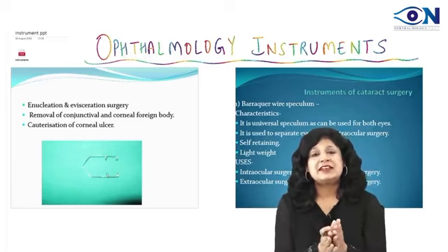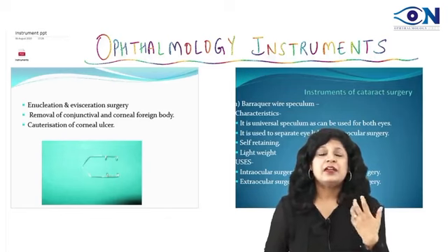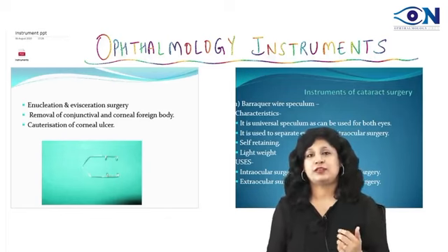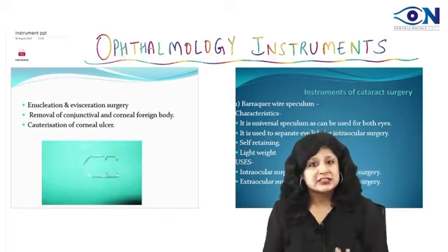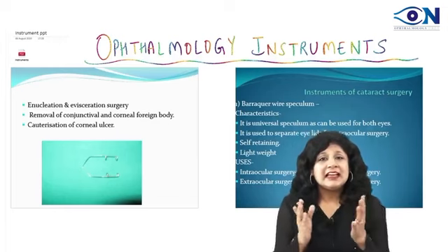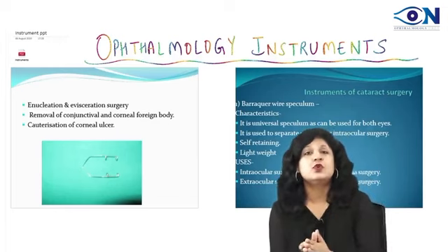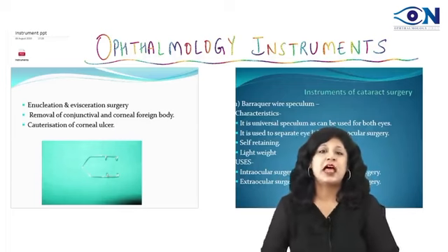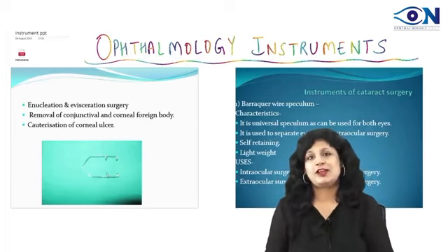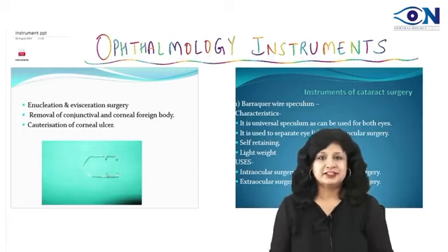But the second reason why I want to discuss the instruments is that while you are going through the theory of ophthalmology, there are so many procedures that you study, there are so many steps that you are studying, so it becomes slightly cumbersome to understand those surgeries or to understand those steps until and unless you have the sound knowledge of the instruments. So let's begin with the first one.